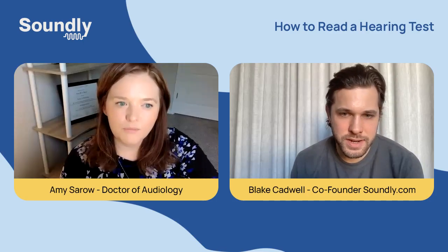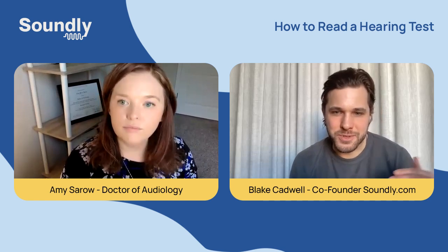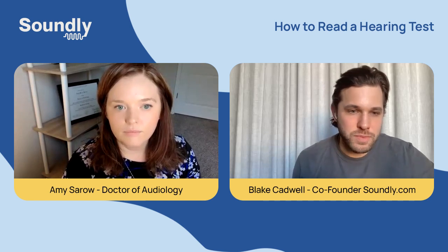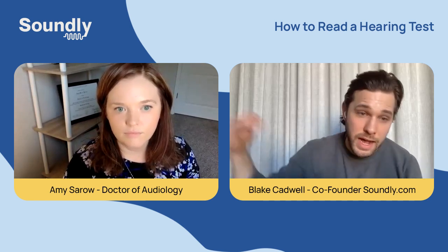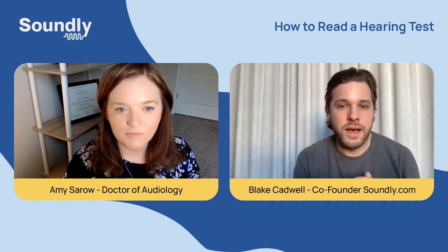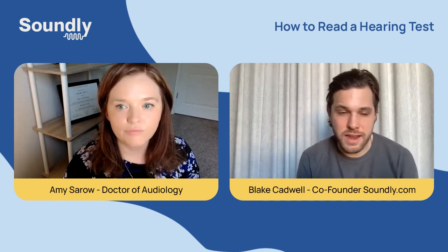As you're looking at a hearing test, in my particular case, I have a cookie bite hearing loss. So to give a real world example, my low frequencies, the tuba or the Barry White, are pretty good. And my high frequencies, the flute or the bird, are also pretty good. But then in the middle, mine kind of goes down. And this is why a hearing test is so important, because everyone's shape is just a little bit different.